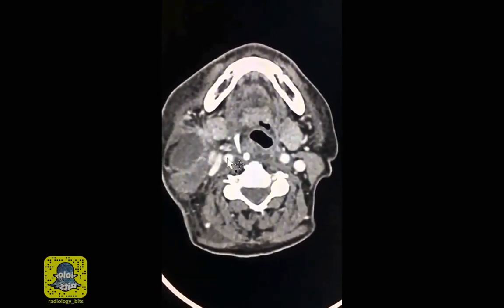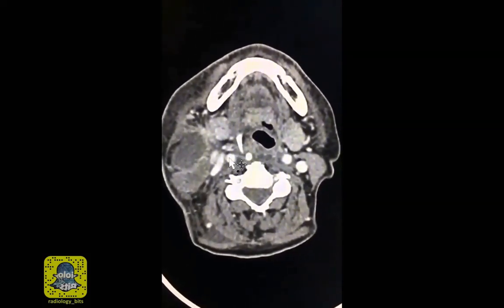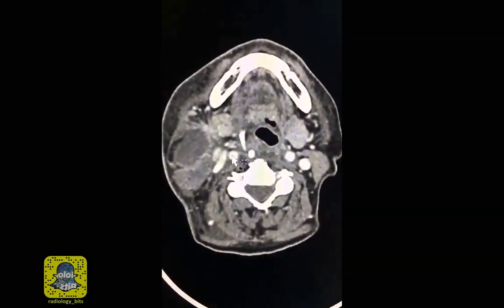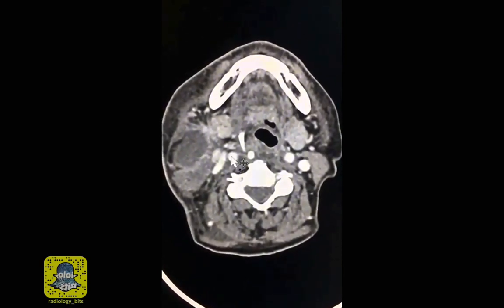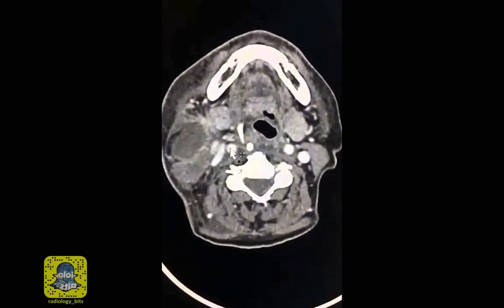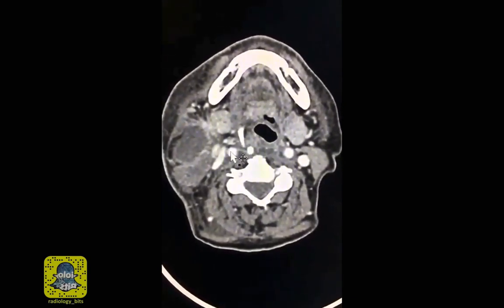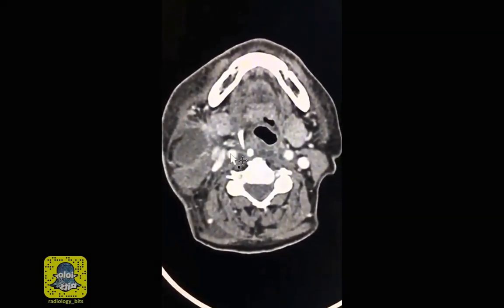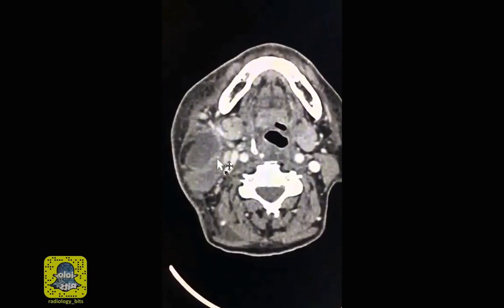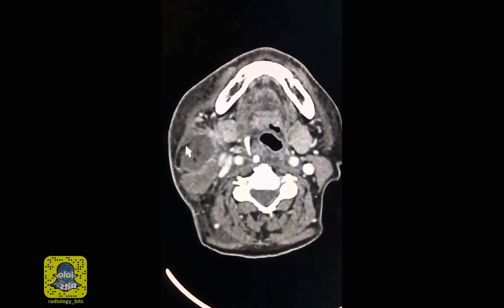Embryologically, there are 5 branchial clefts, the first 4 of which could give anomalies. This branchial cleft could remain as a cyst, a sinus tract, or a fistula. And although this is a congenital anomaly, it manifests in late pediatric age or adulthood, either because it increased in size and it has a dysmorphic appearance, or it's painful, or gets infected or traumatized. So it's there for a while, and this explains why we see this calcific component here. And it's now clear why this patient presented now at the age of 60 years old. It's because it probably got superimposed by infection.